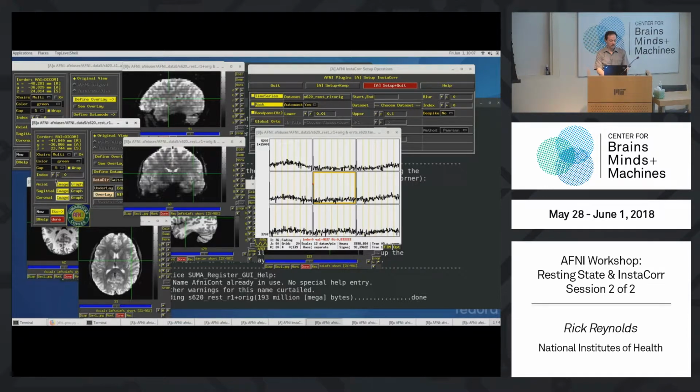If I go forward in time a bit here, you can see the contrast is very different. Time point 0, it's fantastic. If I go to a few time points later, it's still very good, but it's not as good as it was before. This still will register very well, but in some cases, you can look at your own data, and in some cases, it's not as good.